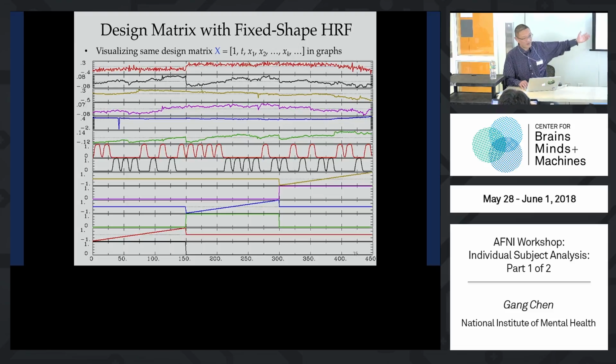Personally, I prefer this way instead of the image, but others may have a different perspective. It's a personal preference, but I like this more because it shows the pattern even better. Once you perform volume registration, which other software packages call head motion correction, but anyway, same thing, once you go through that step, you end up with 6 regressors, 6 parameters.